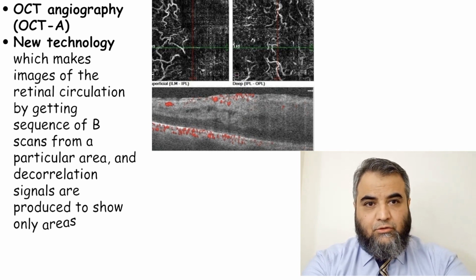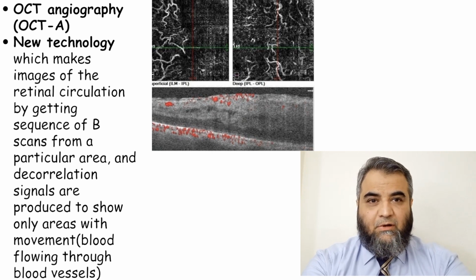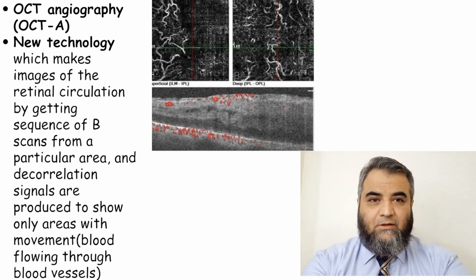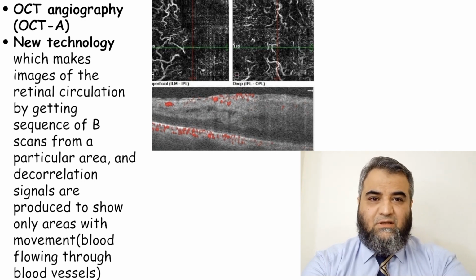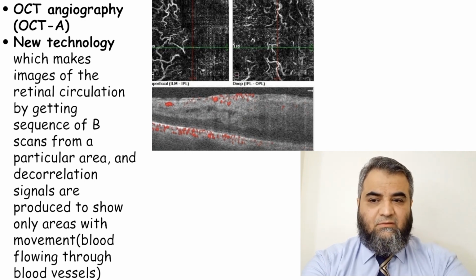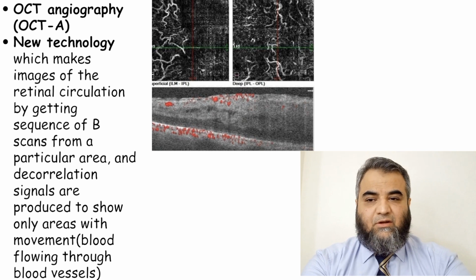We also used indocyanine green angiography, but as new modalities are coming, choroidal neovascularization can also be evaluated with OCT angiography. This is a slide. I have shown you a patient with choroidal neovascularization, where you can see there is a moderate hyperreflectivity in the retina.